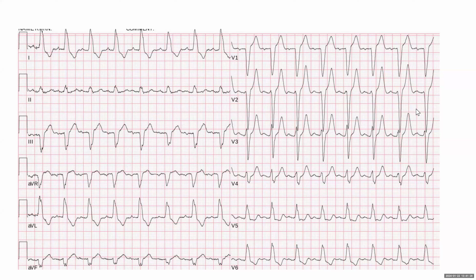And there are ways, I'm not going to discuss them, but just so you know, because in real life this causes a lot of anxiety and so on. Okay, good. Any question about this ECG? With tachy, long QT gets shortened. Correct. So you have to correct for the heart rate, but the major thing here is the wide QRS that will mess up your QT. Good.